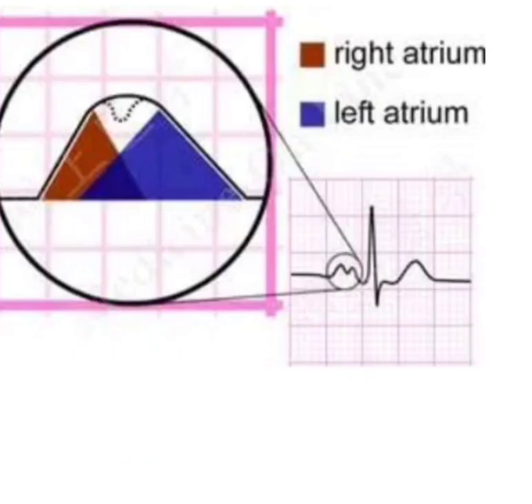In left atrial enlargement, the left atrial depolarization will last longer than normal, but its amplitude will remain unchanged. Therefore, the height of the resultant P wave remains normal, but its duration is more than 120 milliseconds. A notch, a broken line near its peak, may or may not be present, called P mitrale.